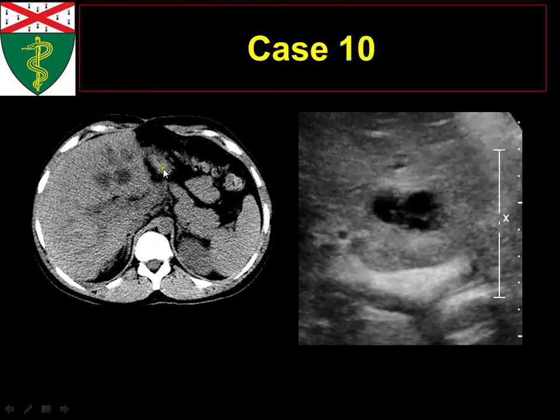Yeah, and this guy comes in with fevers and leukocytosis, so you can have multiple abscesses. Yeah, I think that's very reasonable. It's a transplanted patient, and it smells like multiple abscesses, so what are you worried about? Like biliary ischemia. Yeah, exactly.